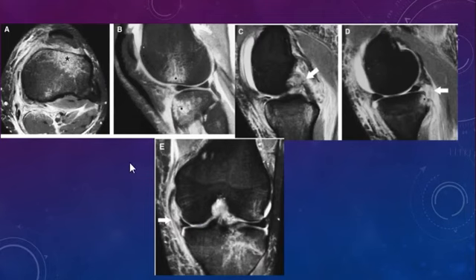As in this case, for example, you can see hyperextension with valgus injury resulting in anterolateral tibial and femoral injuries, and you can see the PCL injury or tear. Also, posterior capsule is ruptured here because it's an extension injury, so always posterior capsule will be affected, and you can see here a tibial avulsion and MCL tear.